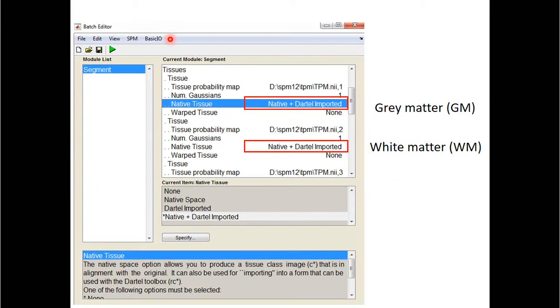It gives you a batch editor. In fact, the main menu is something that came from previous epochs. Actually, everything, totally everything you want to do, you can run from the batch editor. And I will show you, including check range and copy, delete, everything. All the functions are available there.